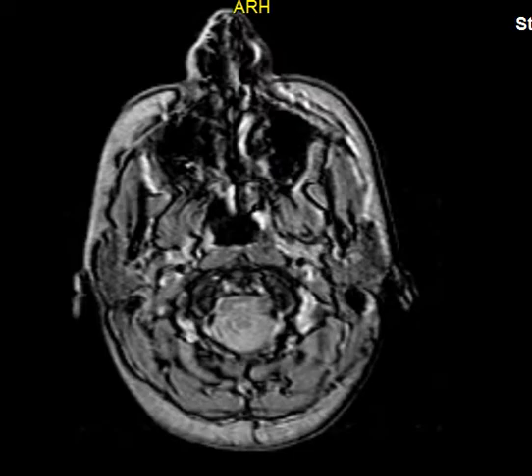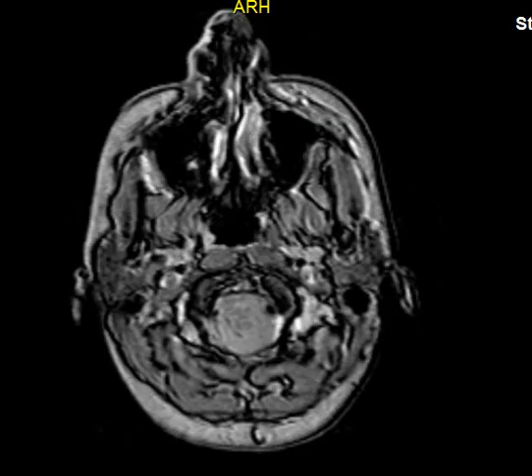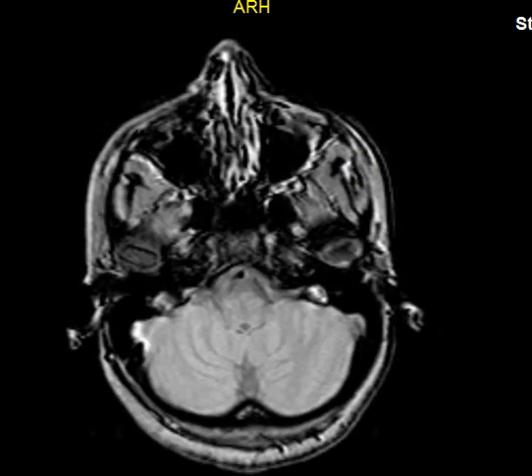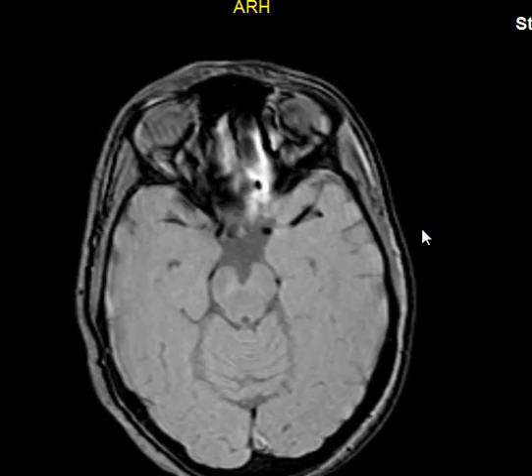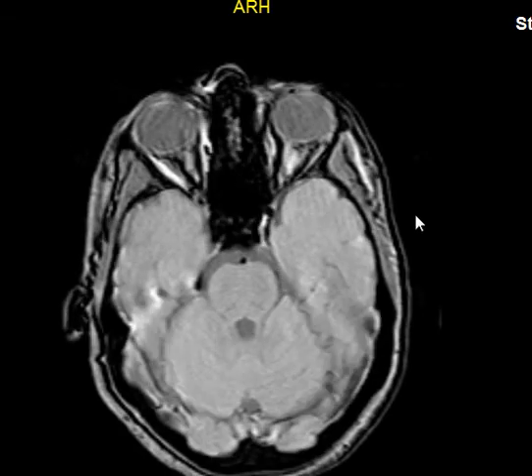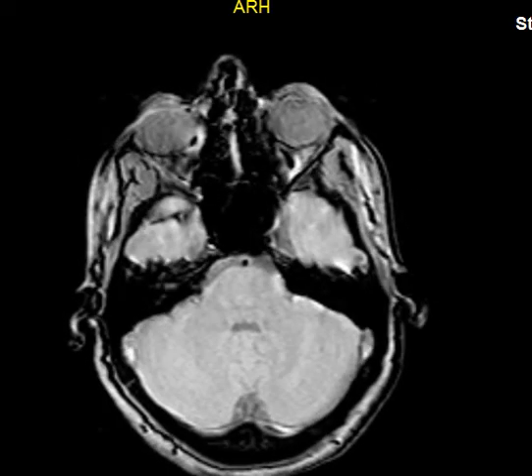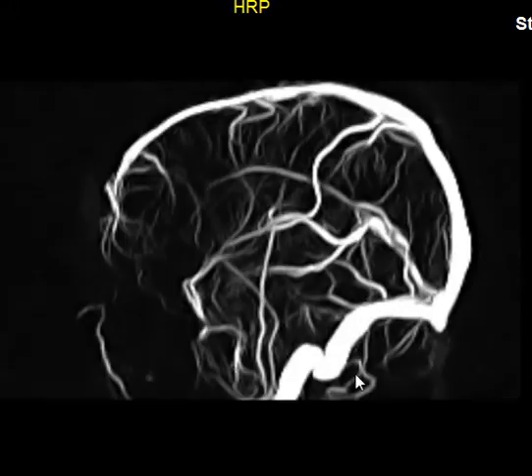So, let's use the few minutes that we have left. I know these are not source images, but let's try. Let's just take a quick look at the MRA and MRV. This is what we call the MRV, MR venogram. We use it to see the cerebral venous sinuses.